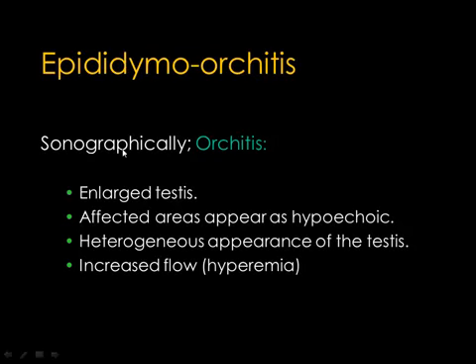If infection is spread to the testes, it will cause the testes to appear enlarged on ultrasound. Affected areas may appear hypoechoic compared with the surrounding tissue, and this will result in a heterogeneous appearance of the testes. On color Doppler, there is increased flow.